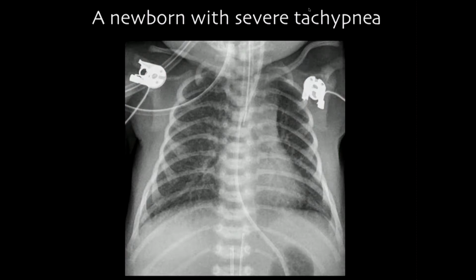So for pulmonary vascularity, you have six categories. One is normal. The second is increased vascularity. Third is decreased vascularity. Fourth is pulmonary venous hypertension. Fifth is pulmonary arterial hypertension. And sixth is uneven, unequal, asymmetric vascularity. One textbook actually describes this as a kind of increased vascularity. To me, it's not. Why?